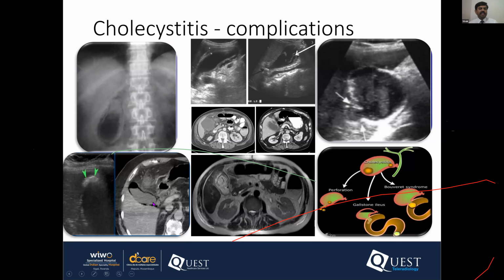Or a gangrene can develop within the gallbladder, where we see the membrane within the gallbladder lumen. You can see the irregular membrane over here. And a differential diagnosis of membranes in the gallbladder is ascariasis in the gallbladder, which is again a totally different condition. On CT and MR again, we make a diagnosis of membranes within the gallbladder and irregularity and additional inflammatory changes and abscess type of formation.